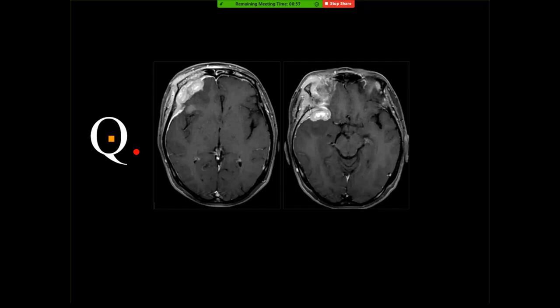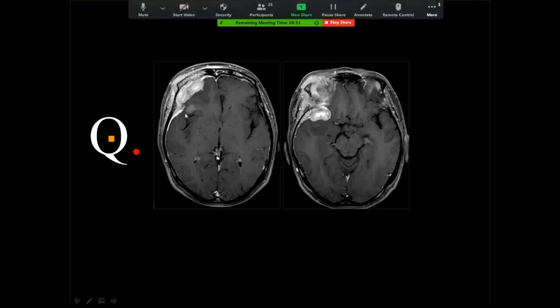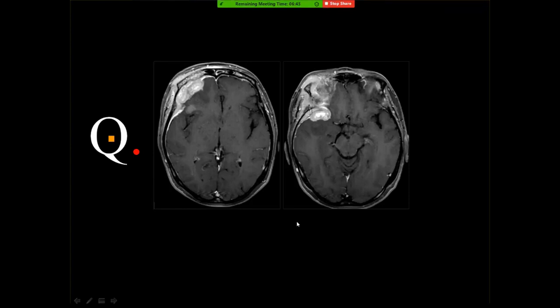Meningitis? Okay, and you see here that there is diffuse meningeal thickening and enhancement, and this may have a lot of differential diagnoses. Either it may be inflammatory or maybe neoplastic. And you remember, I have mentioned this many times, in cases of neoplasm, think of lymphoma and metastasis. And in cases of inflammation, think of TB and sarcoid.